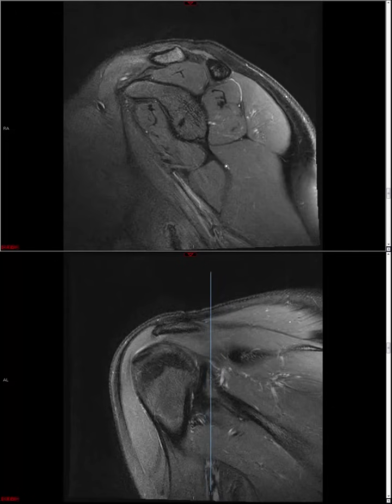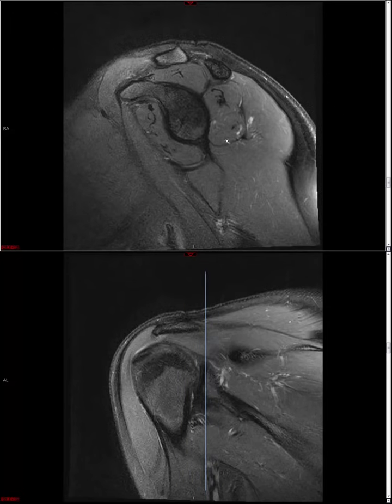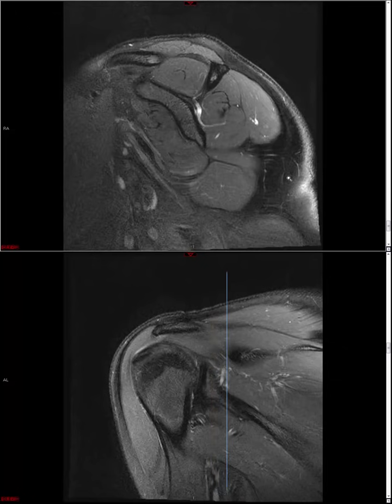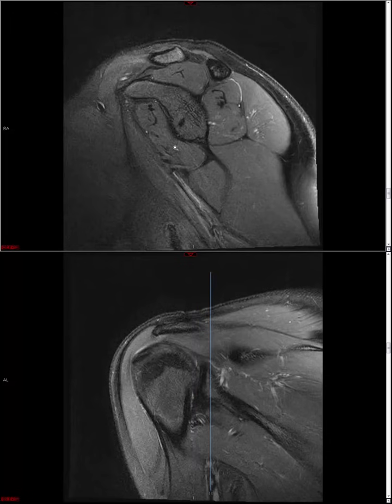It is nice to be able to identify which is anterior and which is posterior on the image. And on an image like this, it's very easy. Here you have your clavicle. Here you have your acromion. Here you have your coracoid process. Also note that the shoulder tends to be oriented anterior superior to posterior inferior, so it will always have this sloped obliquity to it, and you can use that to help you determine what's anterior and what's posterior. But as you do more and more of these cases, there will be numerous hints that will tell you which is anterior, which is posterior.